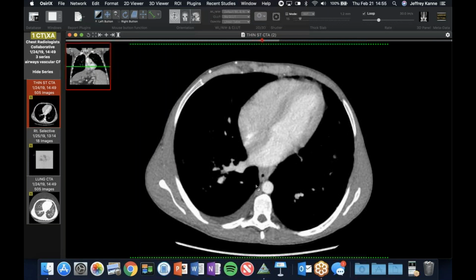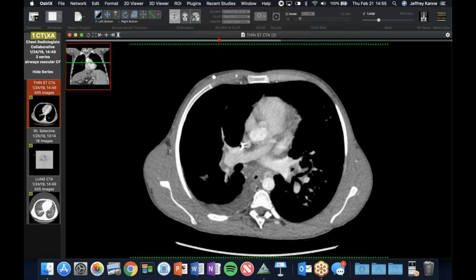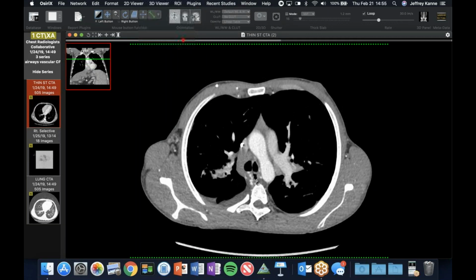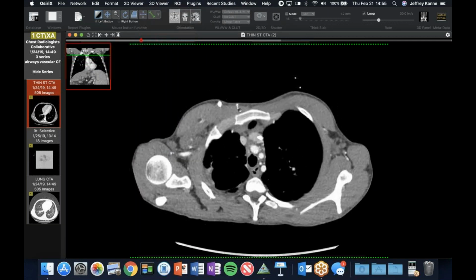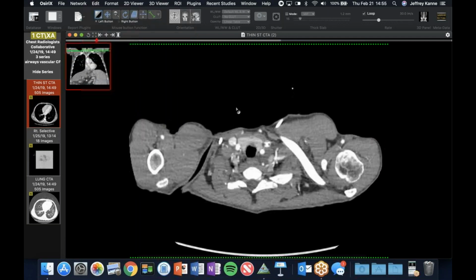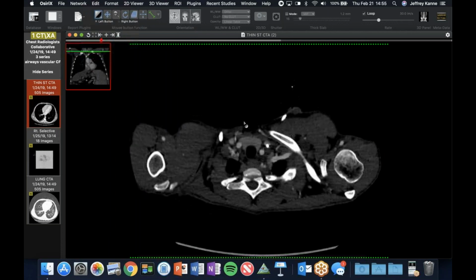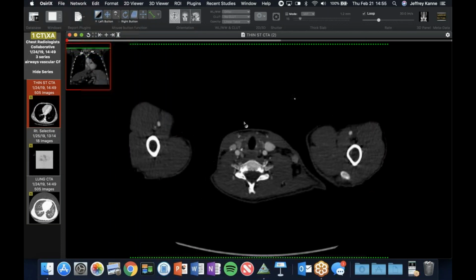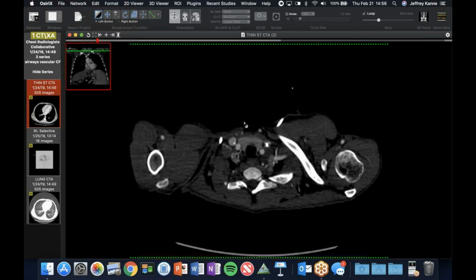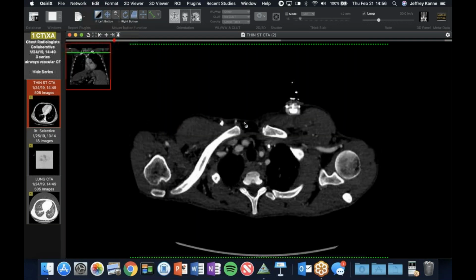Because one thing when you were scrolling through was just, it looked like higher up that, what are those vessels superficial to the right internal mammary artery? Is that a vessel in the anterior chest wall? Right there? Yeah. Yeah, that's coming off. Or is that a? Yeah, I was trying to figure out, because occasionally we'll see. Wow, what is that? It looks like it's going into the internal jugular vein. Huh.